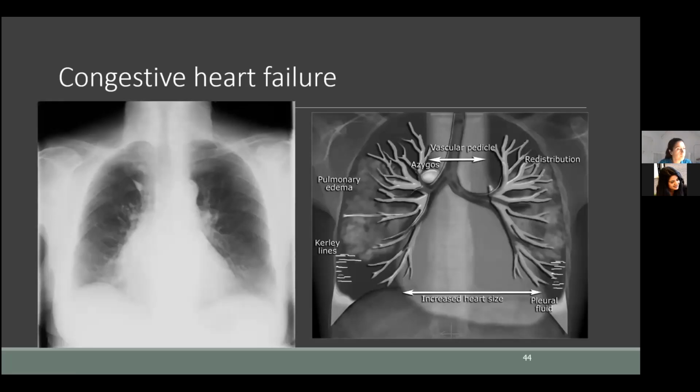So in more severe cases, you will be able to recognize the bilateral, peripherally located consolidations and ground glass opacities. Okay, so recognizing COVID-19 pneumonia on chest X-ray is difficult. In the early course of the disease, it might be really difficult, but in the later course, in more extensive disease, you will see findings of COVID-19 on the chest X-ray as well. But if patients present with diffuse abnormalities on chest X-ray, as we have seen earlier, it is also important to differentiate between other diseases. And congestive heart failure is one of the number one differential diagnoses that we see quite often. So I will get to that as well.